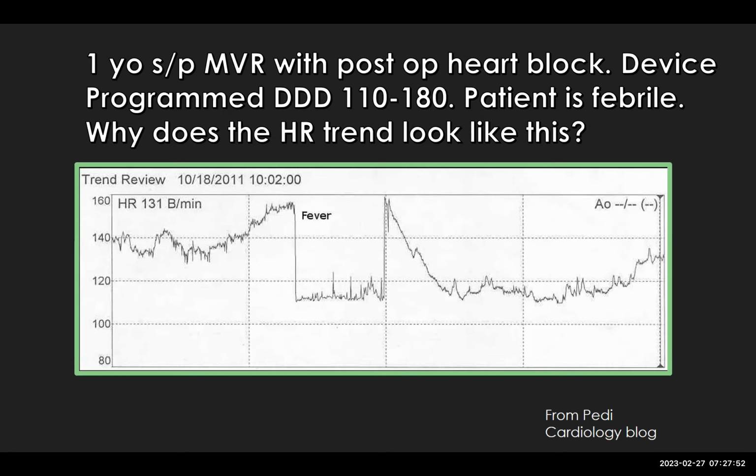So I'm wondering if the pacemaker is no longer sensing the P waves because they're within the PVARP once it got high enough. Yeah, basically that's very, very good, Dave.